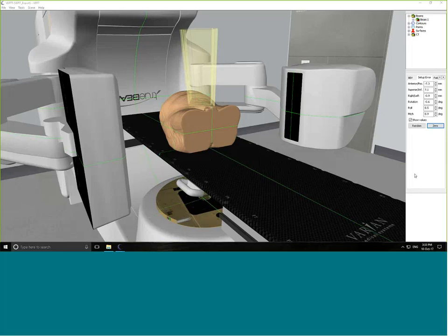Just the features of the window leveling and being able to adjust and match the same way that you matched the CBCT. Yeah, absolutely. It'd be lovely, wouldn't it? A lot of effort has gone into this 3D matching tool, but now that these are built into the software and we have the coding done, it's definitely something we can look to move across to the 2D match tool. Perfect. Thank you. It's a good suggestion, and I'll put it through to the development team.